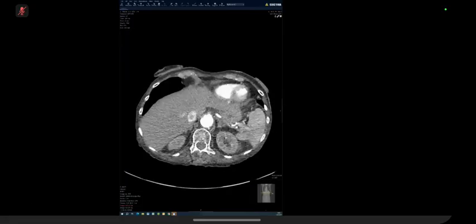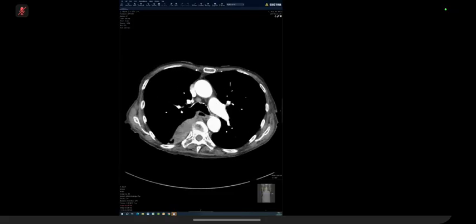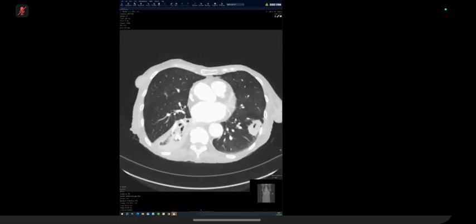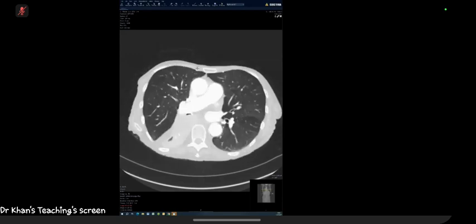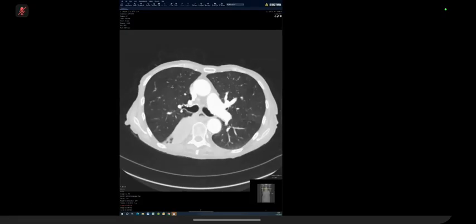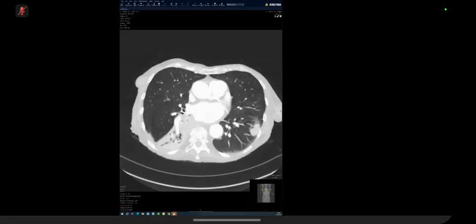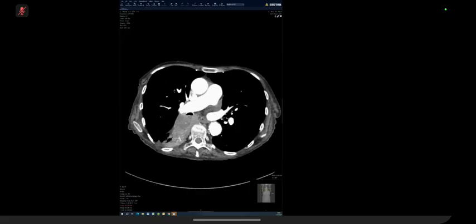Okay, so as seen on the chest radiograph, there's a left lower lobe cavitating lesion. In addition to that, there is consolidation within the right lower lobe. I'm trying to see if there is an endobronchial mass. Okay. It's not there within it as well.